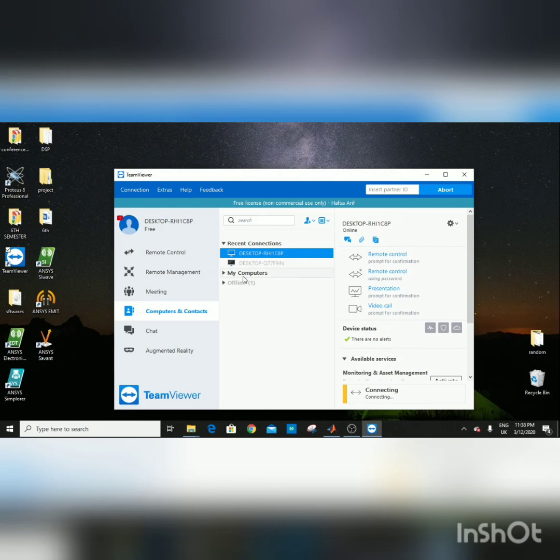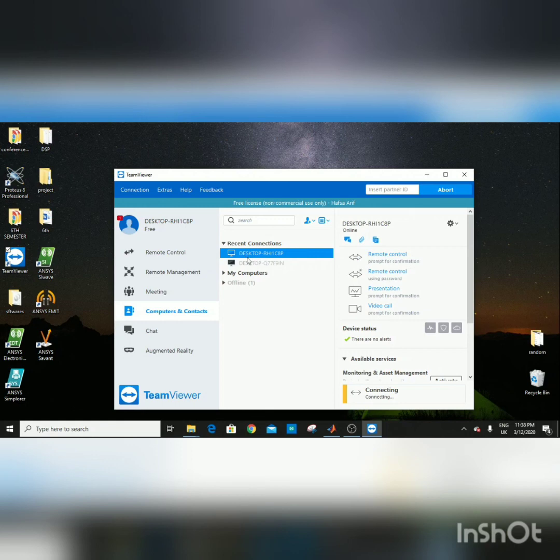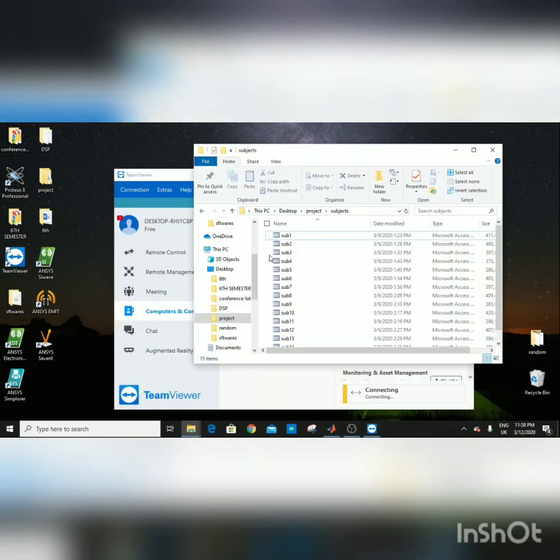It's taking some time. I'm sorry for that, but we will just access this desktop PC from our lab, and then we will use MATLAB on that system, and we will concatenate all of these subjects the way we concatenated our simple trial files and then our experiment files.